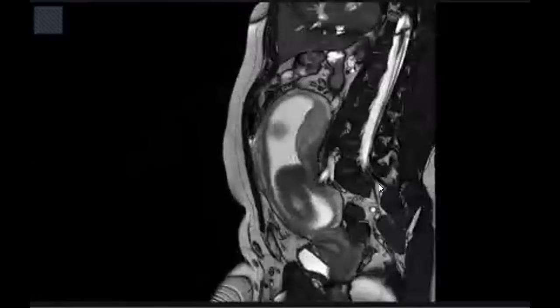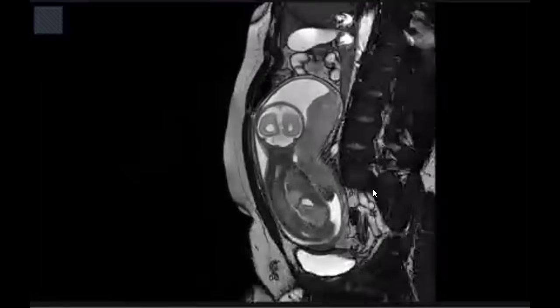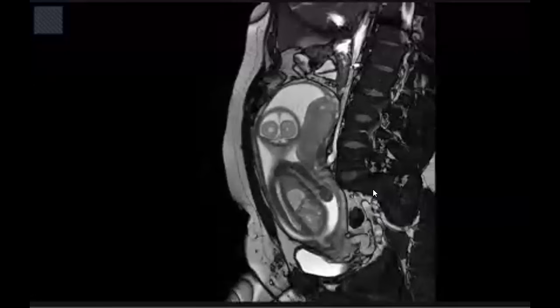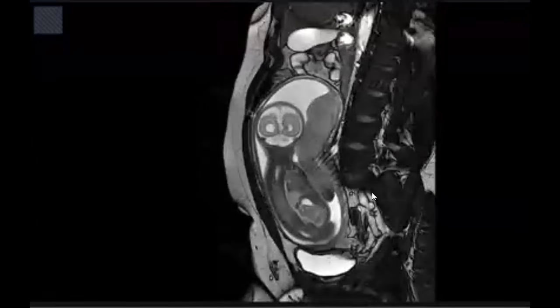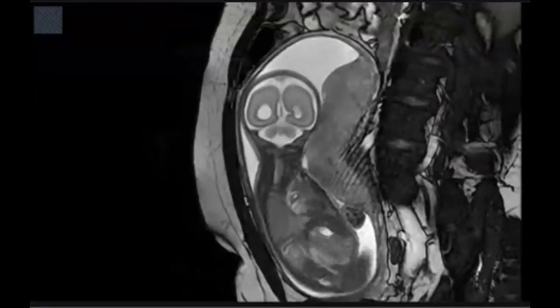It appears high signal, well defined. So it's not purely cystic. So I will remove cyst from my differential, and I think this is. Anything else here? I will zoom for you, please. You can scroll again. Anything inside this lesion that will differentiate the different pathologies?